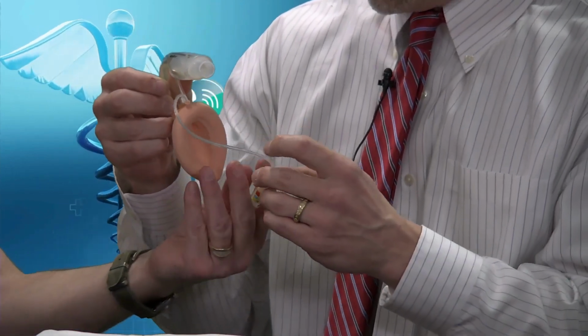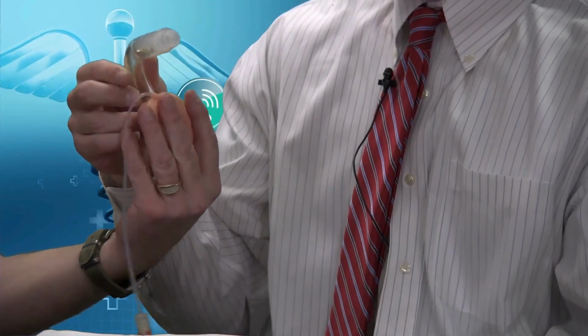And so you don't have a sore throat after that? You don't get a sore throat after this. I mean, but with this one, you might get a sore throat. Is that what you're saying? More commonly get a sore throat with this. Less commonly with this. You still can, but less commonly. Much less common, yeah. I rarely have a patient who needs this, but when I do have one, I rarely, if ever, hear them say they had a sore throat from this.